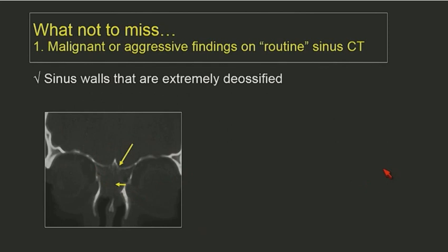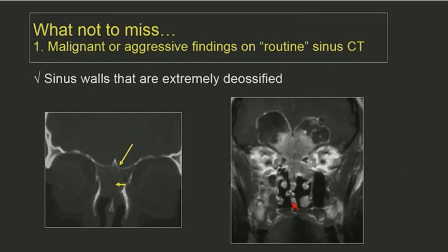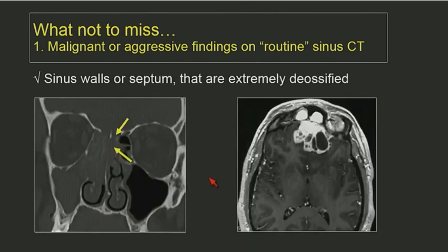This patient had an MRI within 12 hours, and here's the MRI. So this is a massive sinonasal esthesioneuroblastoma. Frankly, I don't usually give a differential. I come out and say this is malignant, and the next step would be blank, either MR or biopsy. But when you see these big intracranial cysts like this, it's a pretty good bet this is an esthesioneuroblastoma. This was read, and I have the dictation in my hand, as sinusitis.